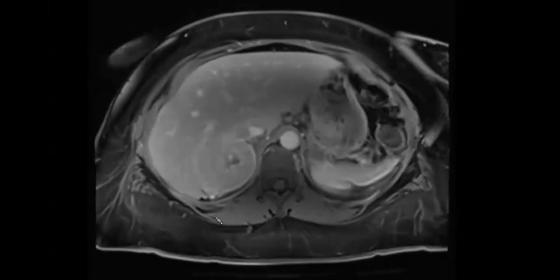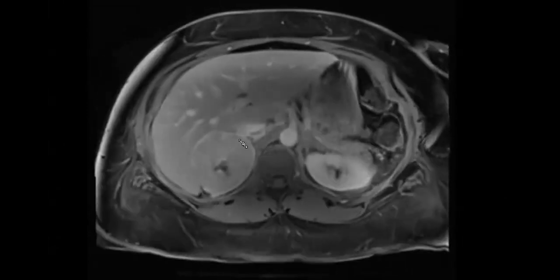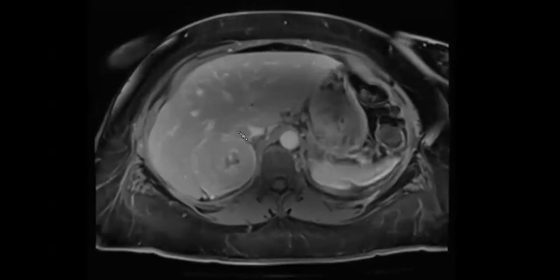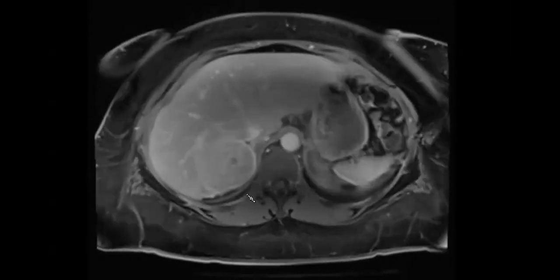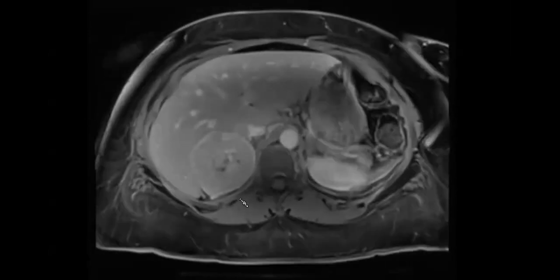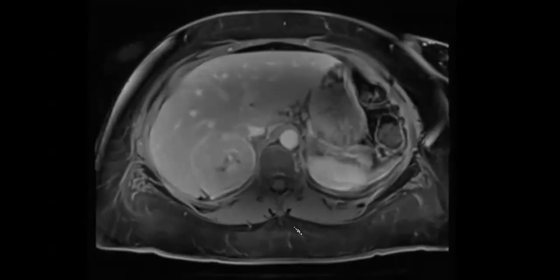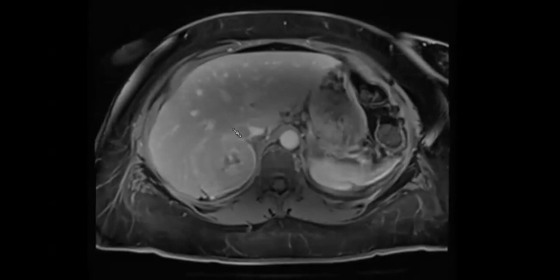Adrenocortical carcinoma. Okay, so that's exactly what we thought. We were like, oh, this is gorgeous. It looks like it's got the central necrosis. It's growing into the IVC. This is ACC until proven otherwise. Of course, it wasn't ACC. This was actually a pheo. The lesson I learned, it was a 7-centimeter pheo.